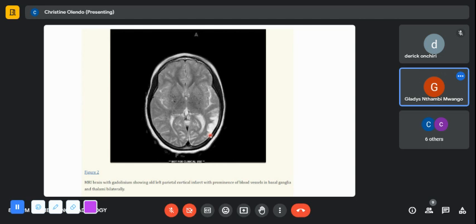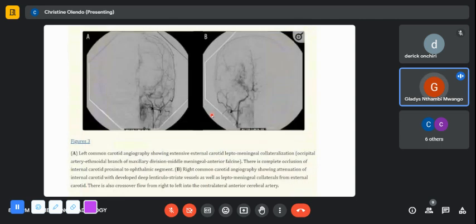Okay. So these dilated perforators, on the next imaging modality, a DSA, look like a puff of smoke. You're not seeing the distal middle cerebral artery because it has been occluded, but now you have that puff of smoke from the moyamoya vessels.